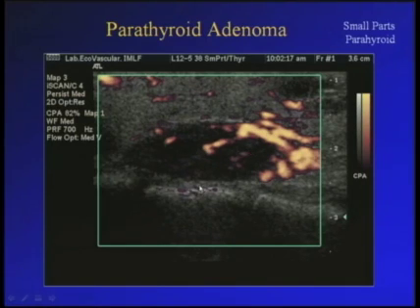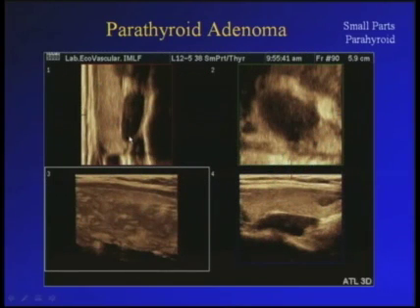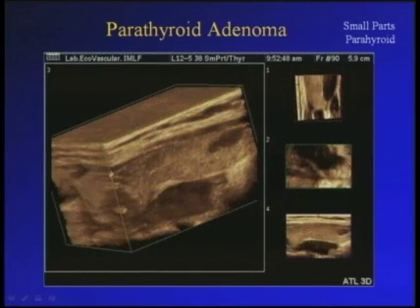It's quite important to determine the presence of these vessels, and this is an important information for the referral physician. And now this same case with a 3D reconstruction. First the multiplanar, and then we have the combination. This is a volumetric rendering, where we can observe an enlarged thyroid lobe with lesions inside the thyroid lobe, and we have at the same time the parathyroid adenoma. This volumetric image is always reconstructed or rendered by processing the multiplanar image first.